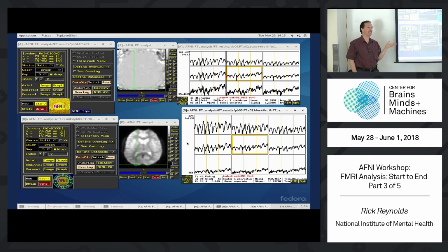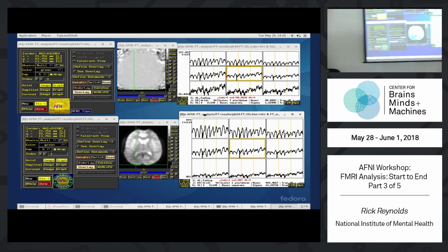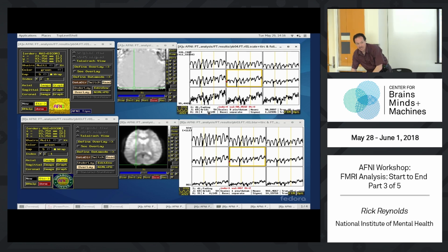They should look exactly the same, subject to any short integer truncation effects. But the shapes of the curve should be unchanged. You might note these look a little shorter than down here. That's just however the windowing is done. But relative, plus the bottom window is taller. Is this called hacking the data if I stretch my window? Anyway, so now this looks a little more similar. So anyway, those curves should look unchanged.